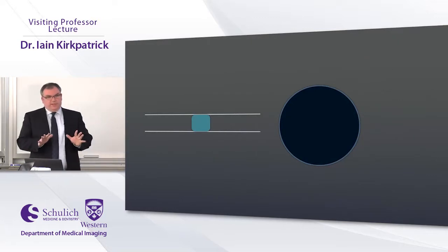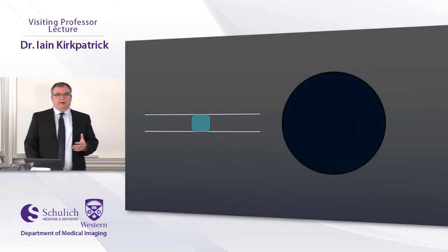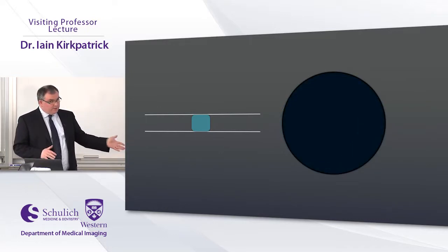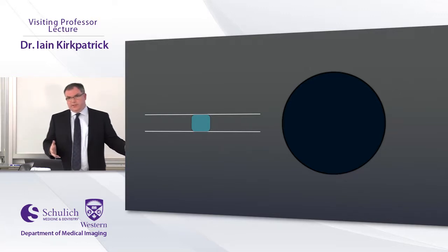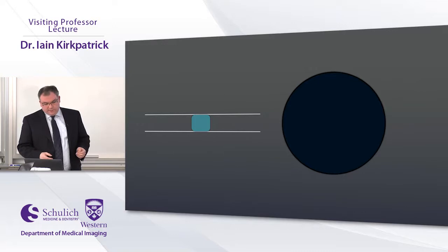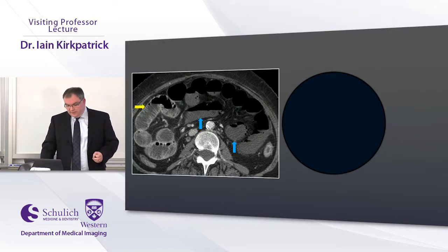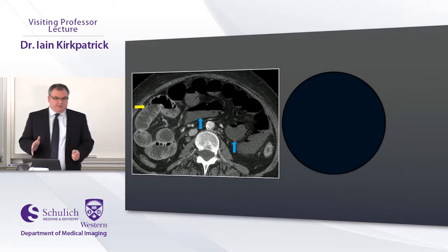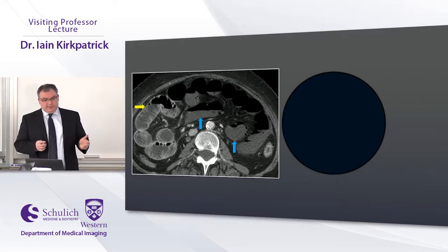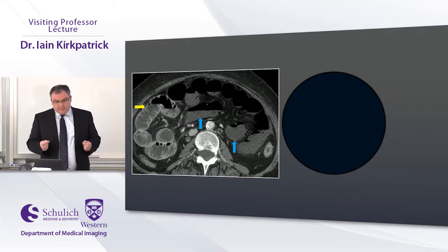Okay, so let's say we don't see any of those CTA abnormalities, then we're looking for bowel changes. And again, the first one we see is an ischemic ileus. Well, that's not super helpful because there's mild small bowel dilatation in practically anybody that walks through the door in the emergency department, so it's not going to tell you if there's ischemia or not, but the wall hypoenhancement is really, really important because this is something that doesn't happen in other conditions, and it is an early finding, and it occurs in a really reversible stage of ischemia.